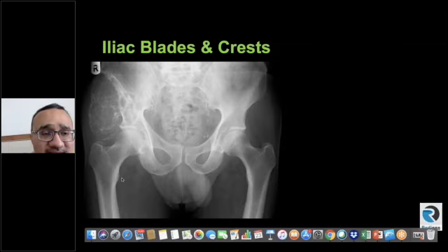In contrast, we come to the next case. You see a large expansile lesion, which is arising from the anterior aspect of the right iliac crest, extending into the acetabular roof, and then the extraosseous soft tissue component is like shell-like. One can say this could be a surface ABC because ABC can be aggressive, but one would be worried that this is some kind of a sarcoma with this kind of aggressive-looking appearance, mixed lytic and sclerotic. When you look at the iliac crest, it's quite heterogeneous.